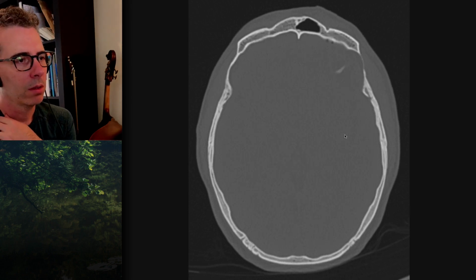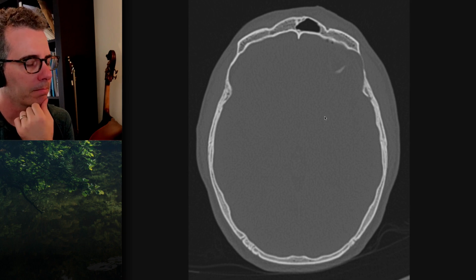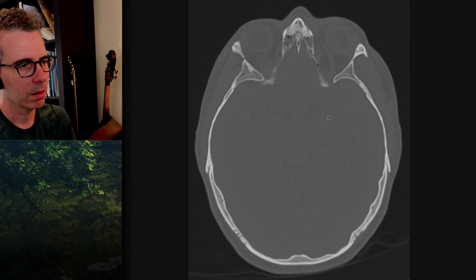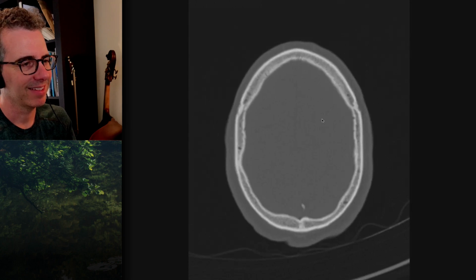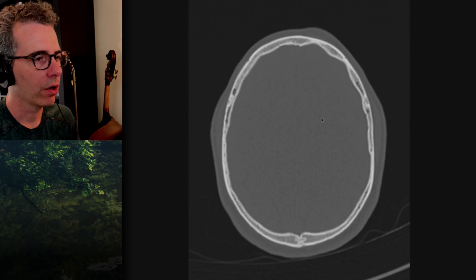Could we go to the bony reconstructions axial to begin with? Yep. I'm actually waiting for your... there you go. There's your screen as well. I'll get it up here too. And if we scroll to the vertex to begin with. The other vertex. Yep, there we go. Yeah. And then we'll come down. And you're scrolling on your own version, right?